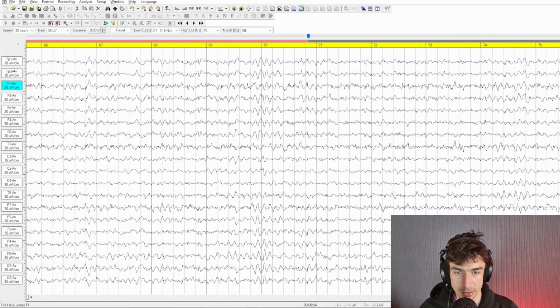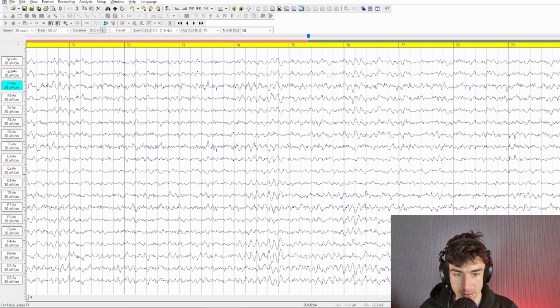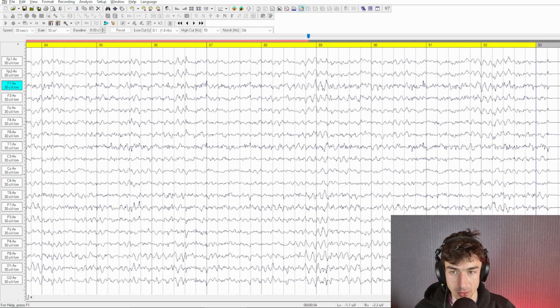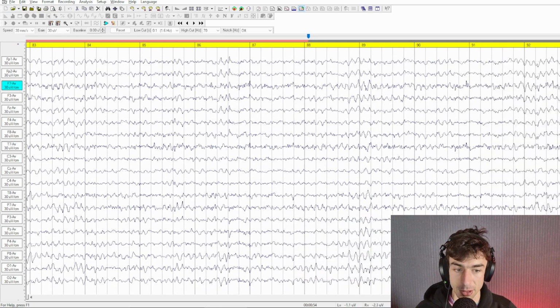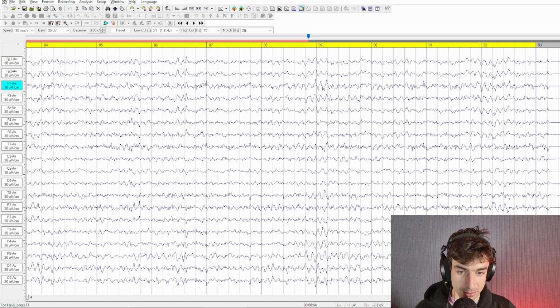And here we are nearing the end of the recording. I really don't know why someone would record such a short EEG when you've done all the work of capping someone. So if you're at Peak Brain LA, take note. The standard is 10 minutes, eyes open, and 10 minutes, eyes closed. And a recording this short, if it were to go to med legal, which is highly unlikely, would be potentially a liability.